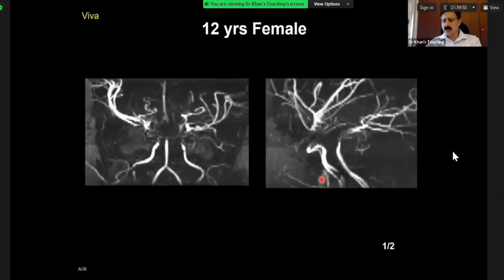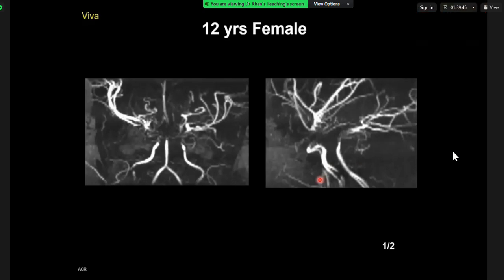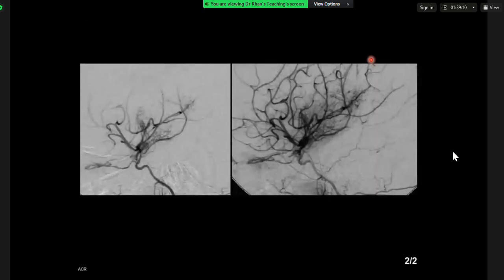Look at this case. What is the finding here? These are spot images from an MRA, and I can see focal areas of concentric narrowing in the circle of Willis, and there's some smooth tapering of the vessels, specifically the internal carotids bilaterally, with some proliferation of surrounding vessels in keeping with Moyamoya. Thank you, Ram.